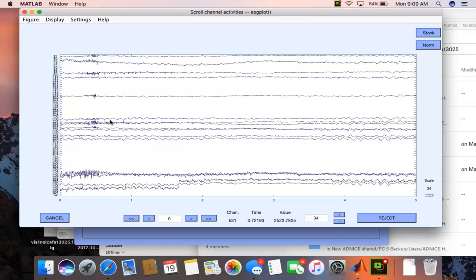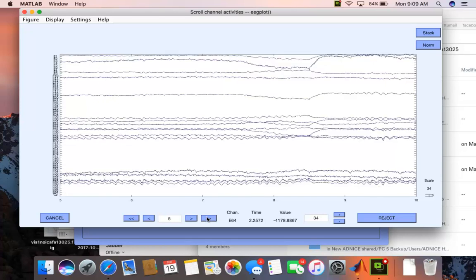These are raw data, imported directly. It's not filtered other than a little bit of hardware and preliminary filtering done in the system itself. When the person doing the analysis gets the data, it looks like this. We'll start paging through, and first of all, you'll notice that not all 65 channels are present. We just see a limited number of channels.